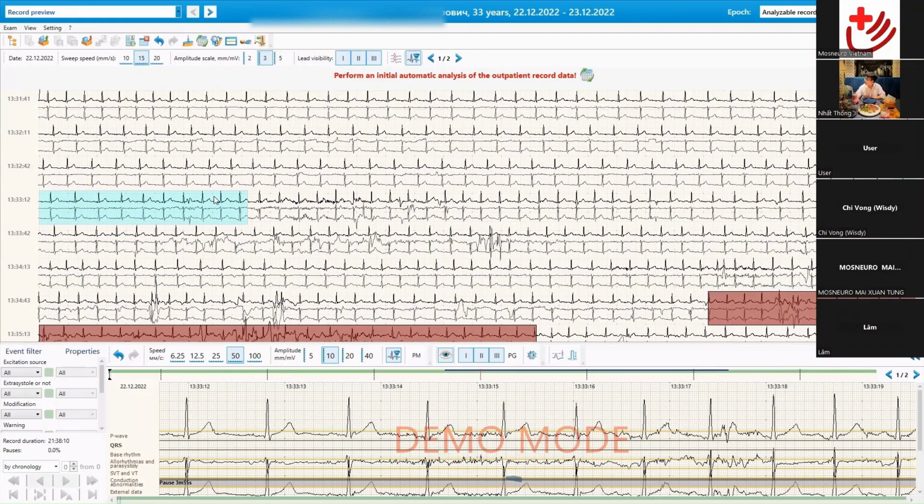The selection process is the general procedure that you can use in different scenarios with our software. To select something, you just need a couple of tricks to remember. If I want to select some small part of the recording, like some seconds or minutes, I'm using a simple way, pressing the left Shift button and then the left mouse button.